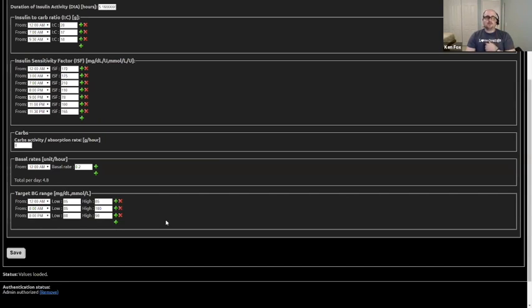This is also, I print this to give to our endo as like a pump settings printout because it's not convenient to do from within Loop. This gets most of this stuff. It doesn't have like your max basal limits, your max bolus limits, those kinds of things, but it has the important stuff. Why does carbs say 0?